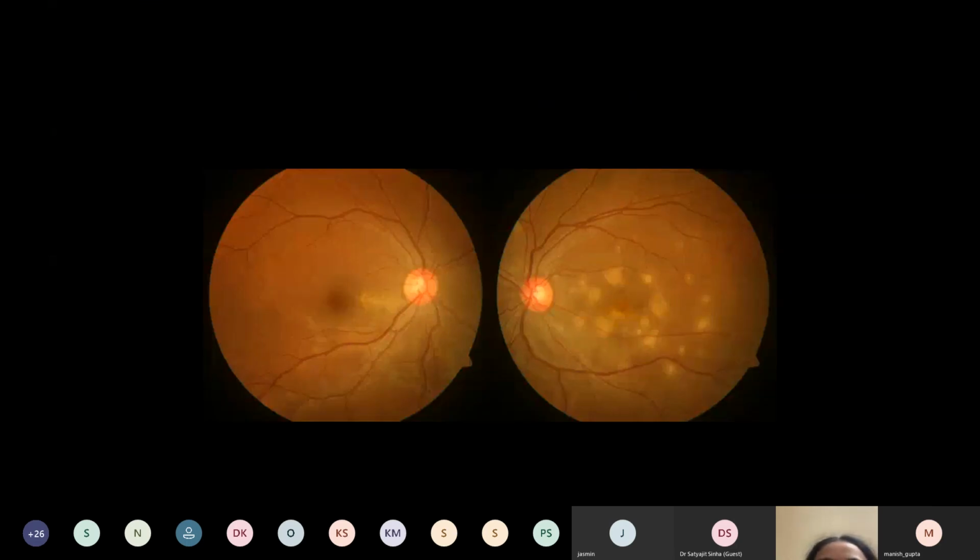So let's see an example of this. You have these multiple hypo lesions. The girl presents with decreased vision in the left eye. So when we did the combined fluorescein and ICG of this patient, now these lesions you can see are quite deep, subretinal. They're not causing any elevation of the retina. They're not causing any exudative detachment around them. They're much below the retinal blood vessels. Right eye looks practically normal unless we do the combined fluorescein angiography with ICG.